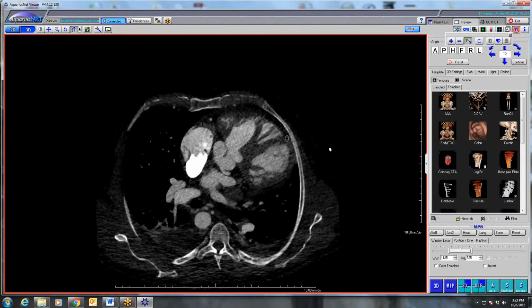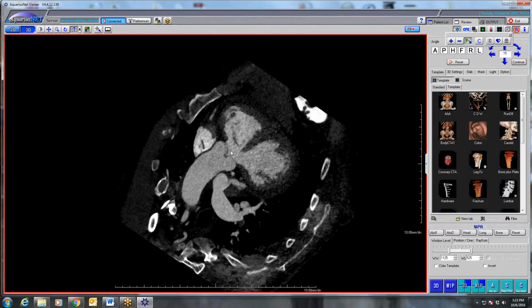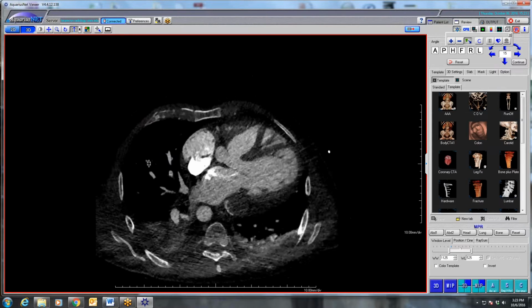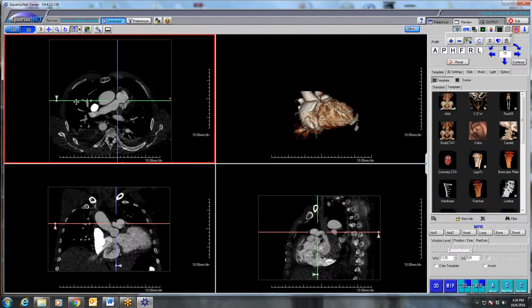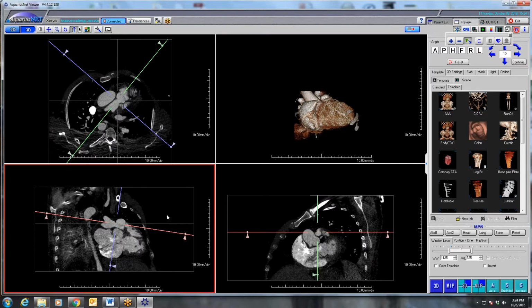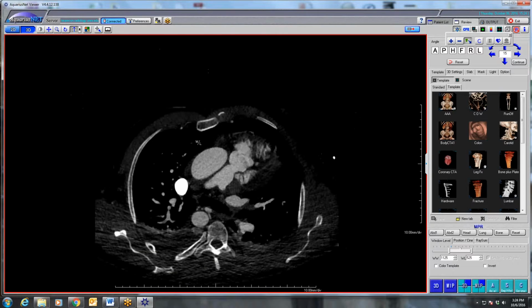He also has a pretty nice classic overriding aorta. You can see that the aorta sits over both the LV and RV here. So here's LV, here's RV, and it overrides the VSD. And then he has RV hypertrophy, which isn't surprising, and then this pulmonary stenosis, which is, I can't remember if this was a couple of weeks ago, just supravalvular here. And he also has some infravalvular narrowing as well. So here's the valve, and here's this supravalvular narrowing. So this is a tetralogy of Fallot, undiagnosed.